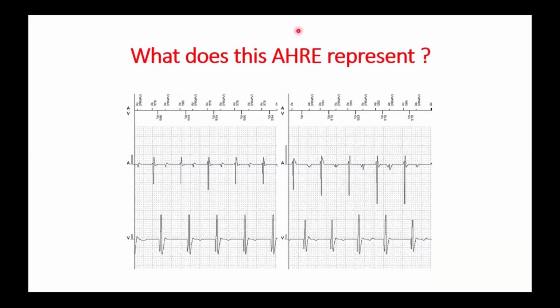This is another type of episode which is recorded, and would anyone like to volunteer and answer this interrogation? Dr. Didier, can you answer this? Didier?